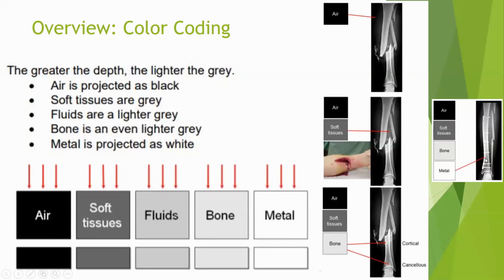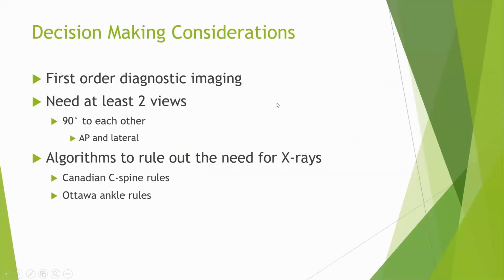And at the end, if someone has an implant, that could be a plate, or a total arthroplasty, knee arthroplasty or hip arthroplasty, even shoulder or elbow. You can easily see those implants right over here, and they are completely white in color. All right, fantastic.